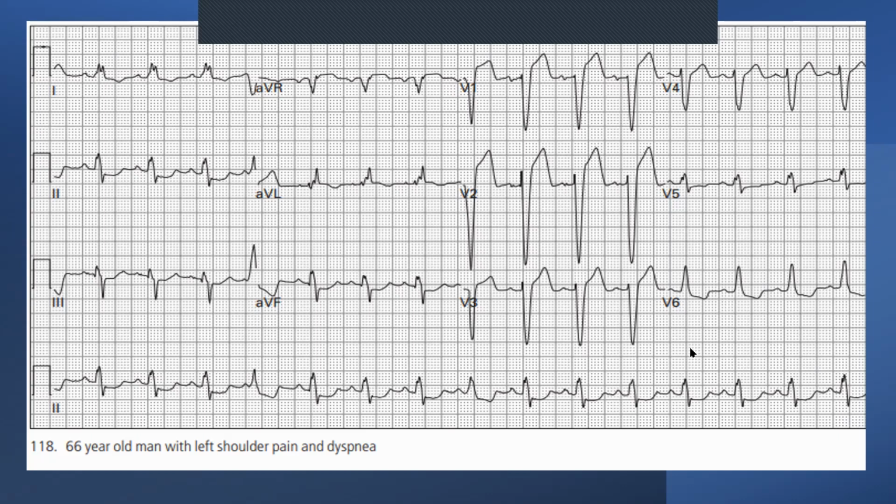So here we've got a left bundle branch block. All right. That's what's causing the problem. So basically what's happening is that as the electricity is passing through the left side of the heart, which is the majority of the heart, its conduction time is delayed. All right. Now remember, you've always got alternative pathways.